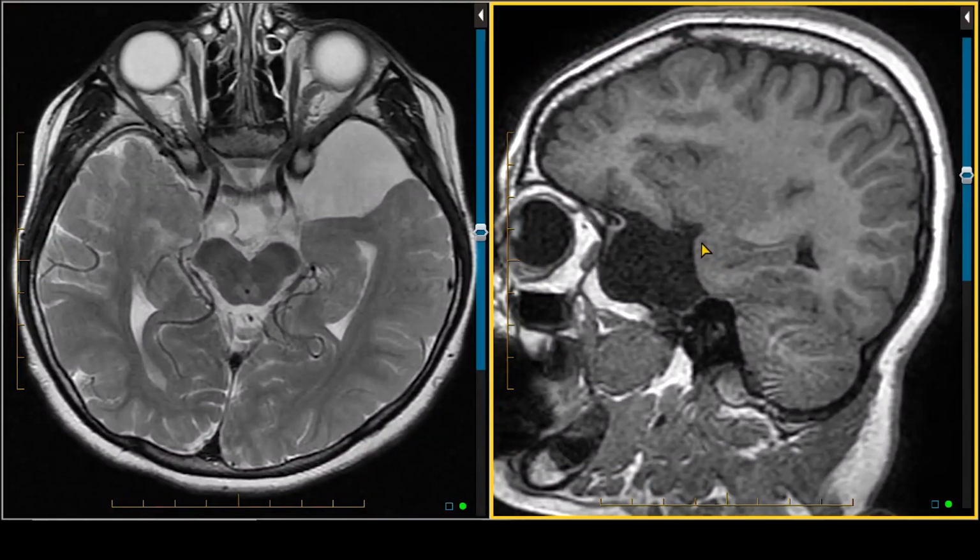It can be bright on T2-weighted imaging, and it can actually suppress on FLAIR imaging. While there are no signs of injury to the left temporal lobe, the space-occupying aspect of this arachnoid cyst does result in slight hypoplasia of the left temporal pole. It also results in slight bony expansion of the anterior aspect of the cranial fossa.